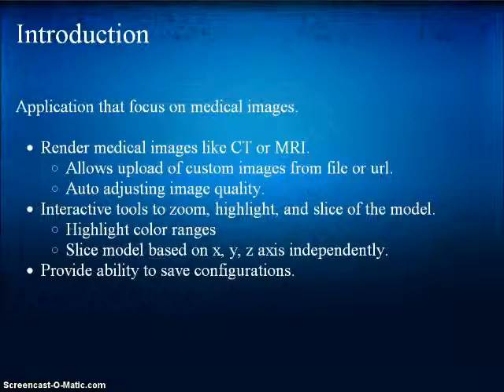Aside from rendering images into a 3D model, we allow the user to zoom in, highlight particular color ranges, as well as slicing. As you can see in a little bit, these tools really help the user hone in on important areas very quickly. And last but not least, we allow the user to save current configuration and load them up at a later time.